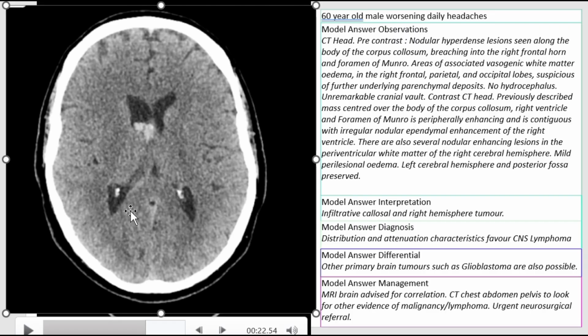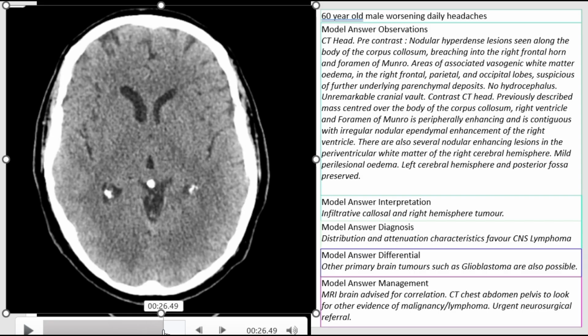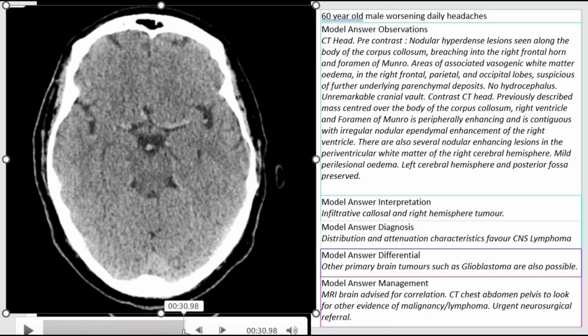The white matter connecting fibers here, posterior to the occipital horns of the lateral ventricle, is the splenium of the corpus callosum. Then if you go down, this is the atrium of the lateral ventricle, and the last part of the lateral ventricle, the temporal horn of the lateral ventricle.